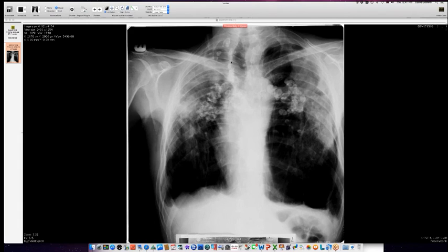So this is the first time I've seen them spread this far away. And I guess these are hilar. Probably the hilar structures are being pulled out into the lung by the extreme degree of distortion here in this advanced silicosis from coal mining. But I just wonder if there are nodes in the lung as well, beyond the hilar nodes being pulled out, that share this eggshell pattern.